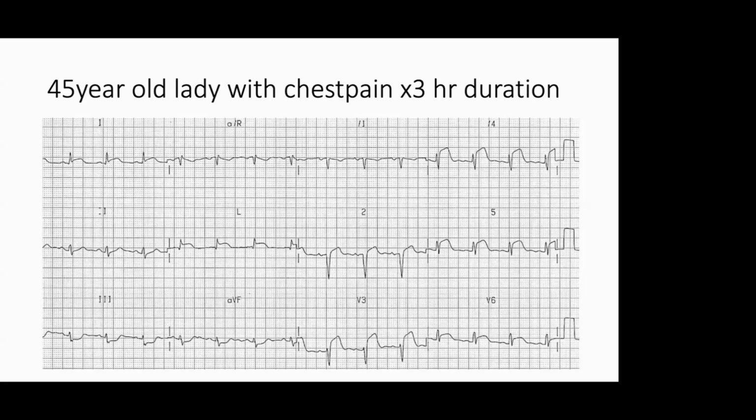This is already 3 hours in. We'll go by 3 hour, 2 hour, 1 hour, half an hour changes from this ECG onwards. So if you go fast, you can cover most of the ECGs.